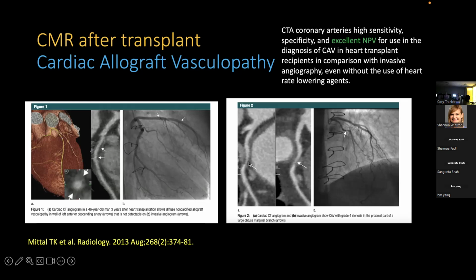And this is an example of when the lesion is just focal, causing focal stenosis of the large obtuse marginal branch by the wall thickening. It correlates with the lesion seen on the angio study. Although these patients are not receiving metoprolol or beta blockers to control the heart rate, scanners nowadays are really fast. The study can be tailored to retrospective gating and can generate really good images for evaluation of the arteries.